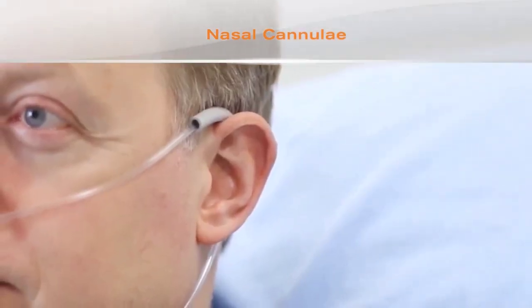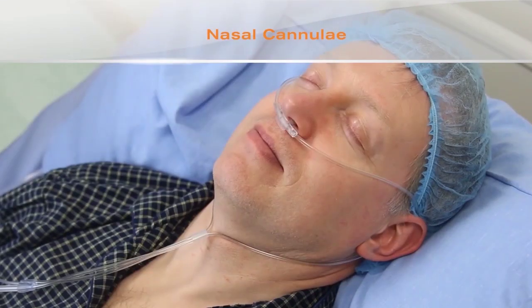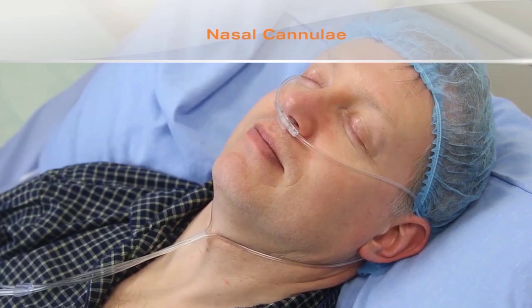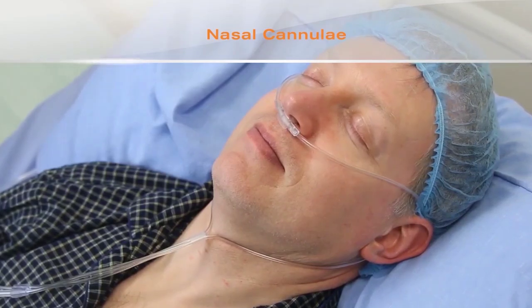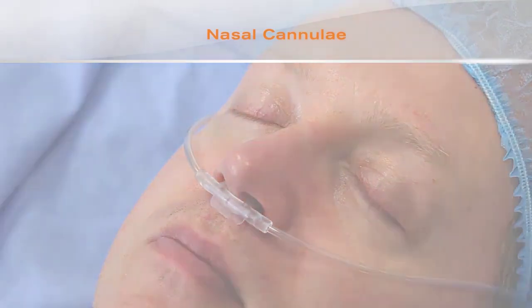Nasal cannulae can be supplied with ear guards, which can benefit long-term users of nasal cannulae by preventing sores on and around the ears. Nasal cannula are also available which allow sampling of exhaled carbon dioxide in non-intubated patients, and the Intersurgical devices with this feature are called Sentry nasal cannula. These devices are suitable for patients undergoing conscious sedation where respiratory depression needs to be monitored.